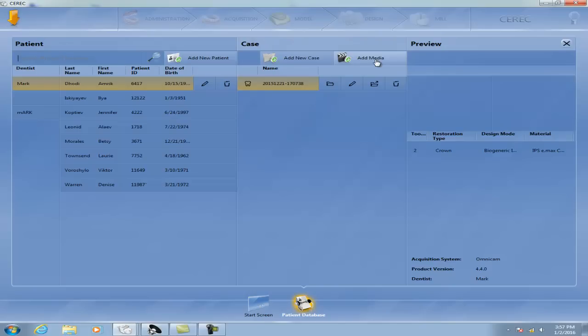For all the dentists who are working with insurance companies, it's also easy to send with your insurance claims all the pictures you've taken through the procedures, to show the insurance company that there was existing decay, and that's the reason you've been changing the restorations or the procedures. Again, these additional features are much more helpful compared to the 4.3 software. You can add several different files without exporting and go on to another one. So there are much better features in the 4.4 software compared to 4.3.